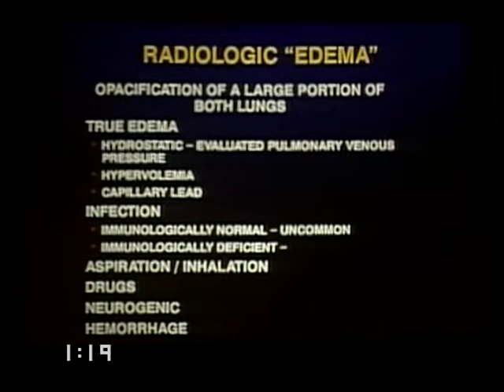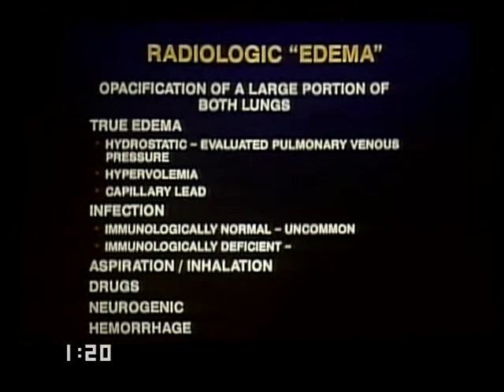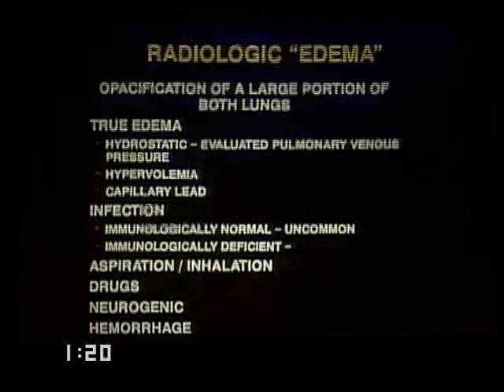Whenever possible in interpreting chest x-rays, if there is a means to cheat in order to establish a diagnosis, by all means do so. If there is an endotracheal tube in place and the patient is in the appropriate setting, you can be pretty sure that this kind of thing is ARDS, because these are very, very stiff lungs.